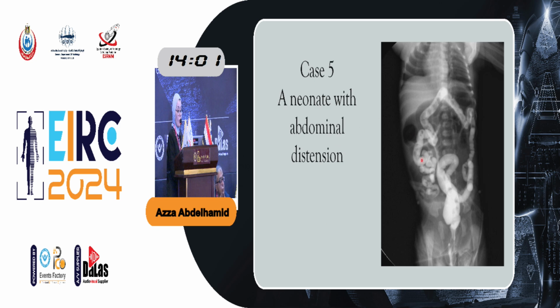In that case here, you see also dilated bowel loops, but you see microcolon on the left side and many filling defects within the colon as well as the distal ileal loops.